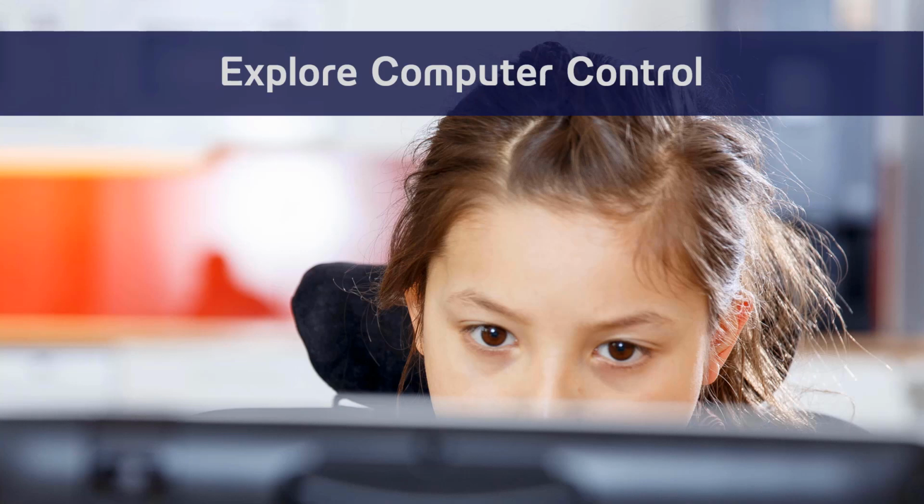Computer control is the newest method of Windows control for the brand new iSeries and the IS5 eye trackers. Today, I'm going to walk you through the application and show you how it can be used to help our eye gaze users.